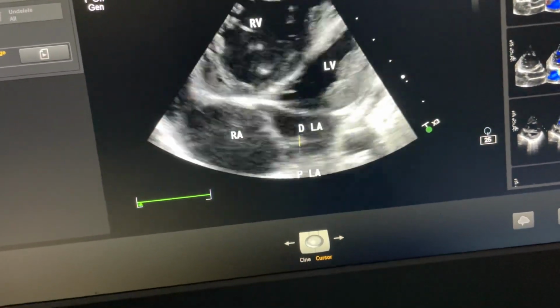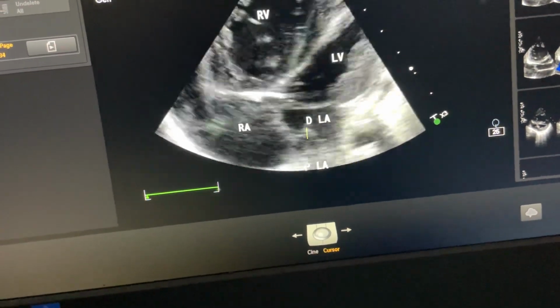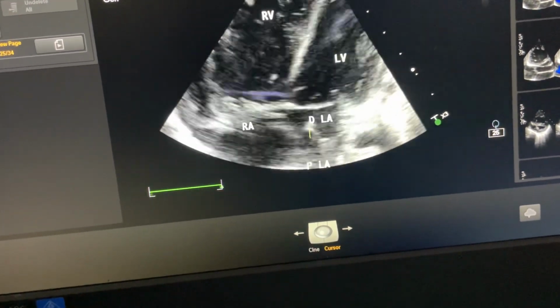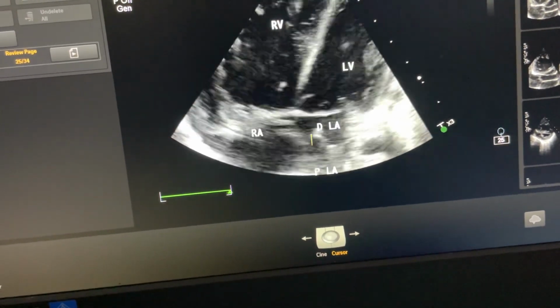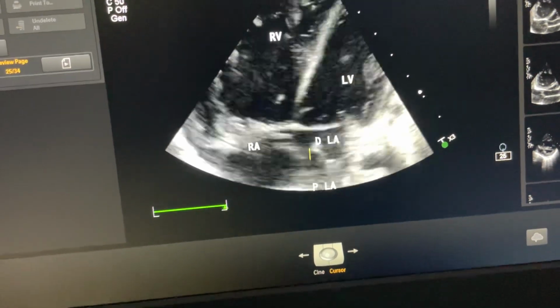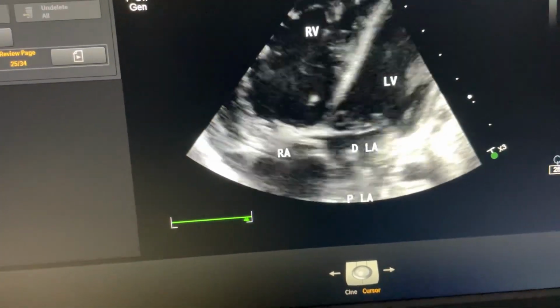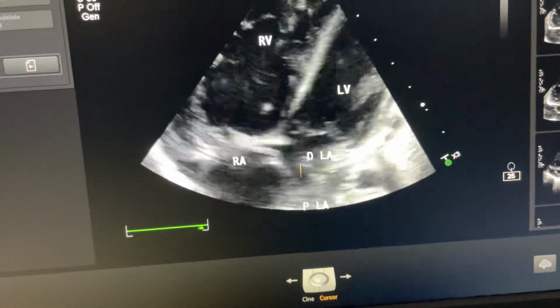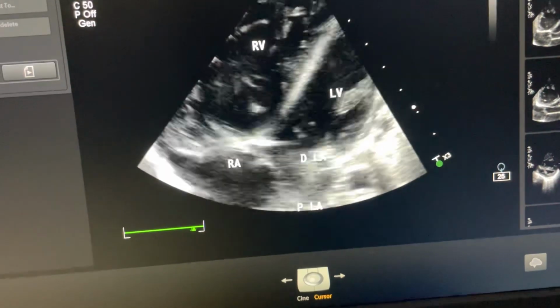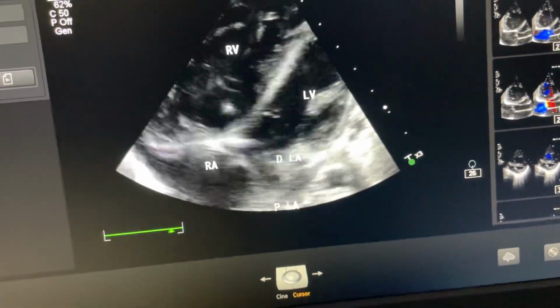So similarly in this case, there is obstruction between proximal and distal chamber of left atrium. So a little bit of perforation is in the septum. So there is very much obstructed flow here. We will see the obstructed flow in the next slides. That has caused pulmonary venous hypertension, pulmonary arterial hypertension, and right atrial, right ventricular hypertension; right ventricular systolic pressure is severely raised in this case.